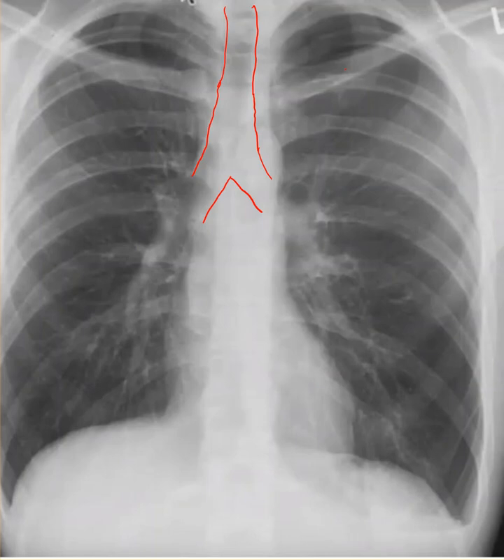B stands for bones, and I generally start with the clavicles. And you can see the clavicles here, and it looks okay. And on this side is fine. And then I move to the ribs, and I'm not going to go over every rib. I went over them earlier, and I know there's no fractures. You can see the big first rib back here.